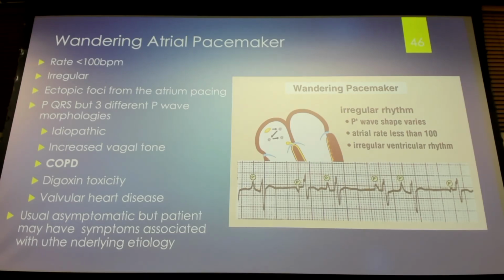It's usually due to something like respiratory disease, like COPD. It could also be due to valvular disorder or increased vagal tone. What does this sound like to you guys? MAT. This is MAT in a slow version.